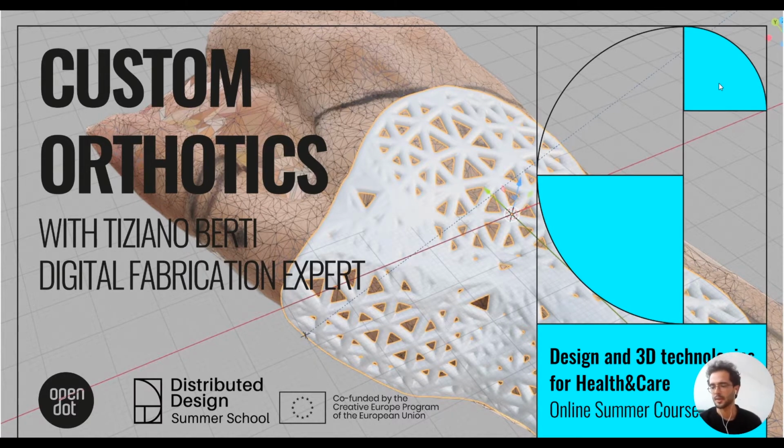We have already seen how to make photogrammetry from photos in order to make orthotics for the wrist, and for my face in this case. We have already used Visual SFM and Zephyr 3D, which is just for Windows. And now we are importing those files into Meshmixer.